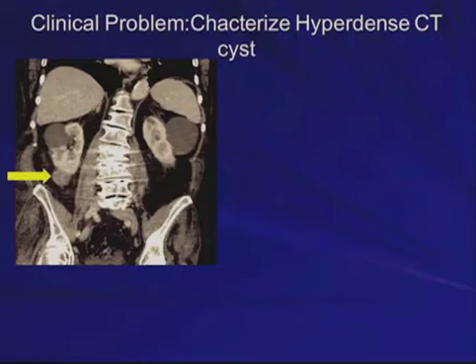This was a clinical problem in which ultrasound co-registration really helped. What happened was this patient was sent to ultrasound to characterize this hyperdense CT cyst. Well, unfortunately, the patient was sent into a room initially without co-registration, and so the sonographer thought he had the cyst, and it turns out he didn't.